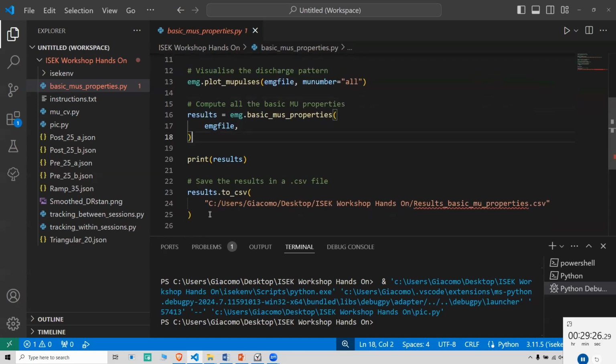And as you can see here, we used 25 lines, including comments, including spaces, and also formatting of the code. So 3 lines are essentially 1, which means using the library is potentially really simple. It doesn't take a huge amount of code to write, and this is the advantage of using functions.